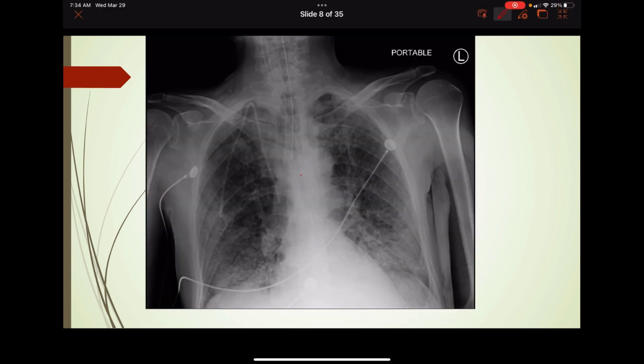And another x-ray, starting off with A. Here's your trachea coming down, and it looks like it's going to be difficult to pick out the carina on this one. So you can look at the window, just a quick dirty method. So the carina should be right about here. And you can also count down.